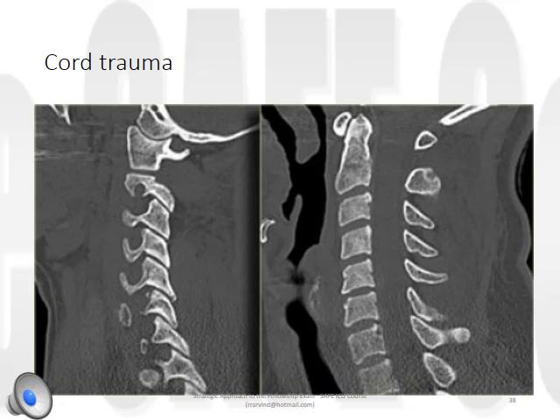So another use for the MRI in trauma is in the so-called SCIWORA injuries, where you have perhaps a normal X-ray or limited pathology on a CT scan, but significant neurologic deficit. So here we have an example of a 44-year-old female who sustained a fall on ice and then fell again the following morning.